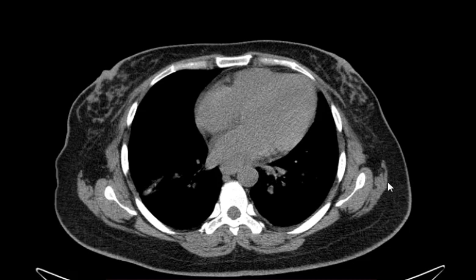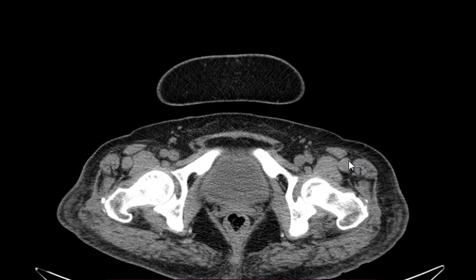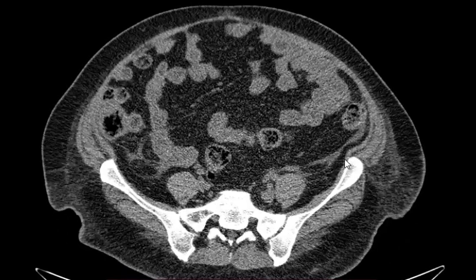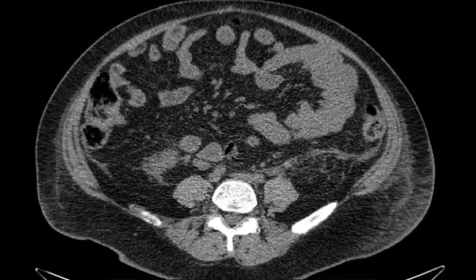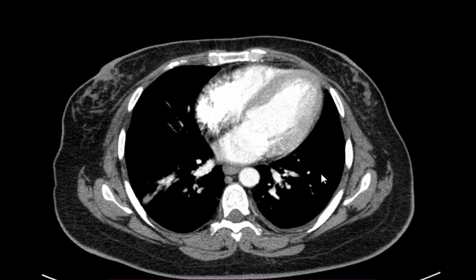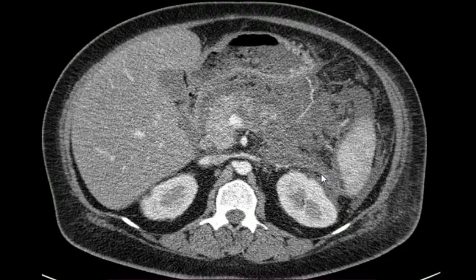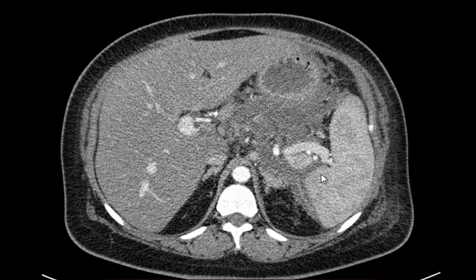So first of all, what is this exam? CT abdomen and pelvis. With or without contrast? This is without, but we have some with images. This is with contrast. Oral or IV or only oral or only IV? It's with IV contrast and mainly arterial to venous, somewhere in between. Late arterial. Okay, exactly, late arterial phase.